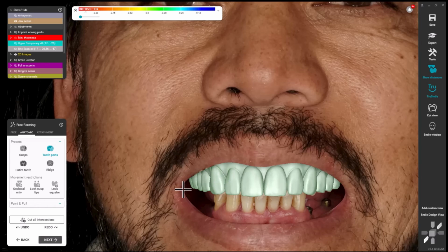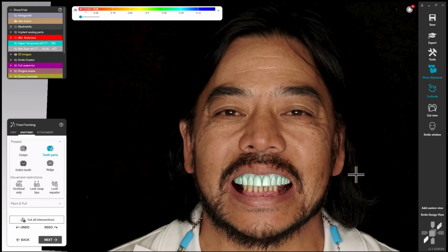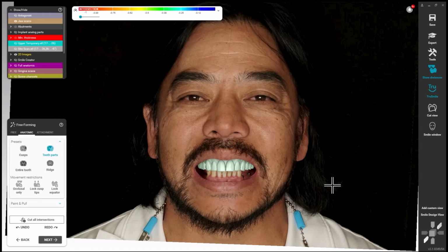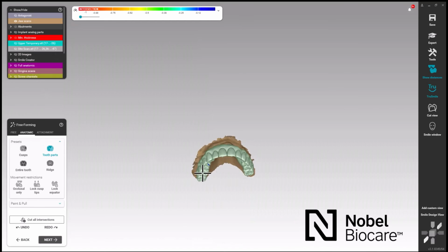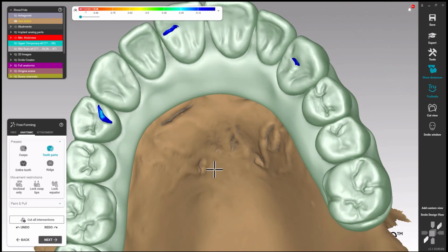Well, I'm in a pretty good position where I like right now. Turn that off. Now let's fine tune our bite.